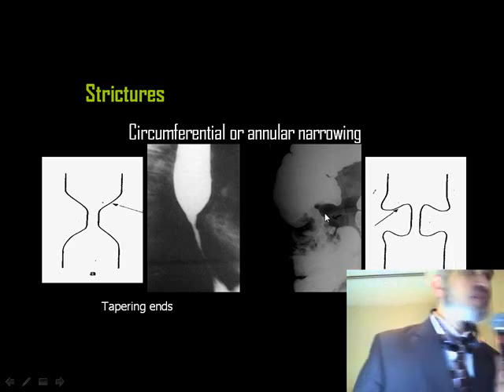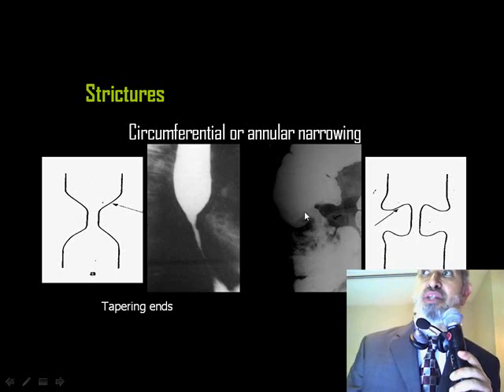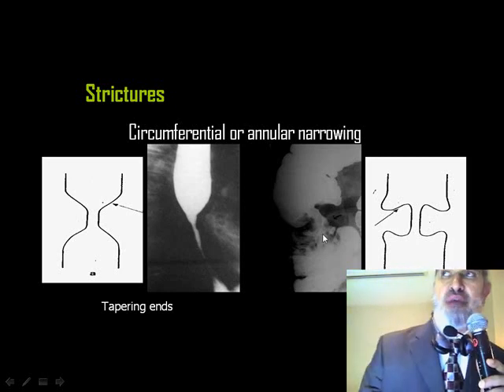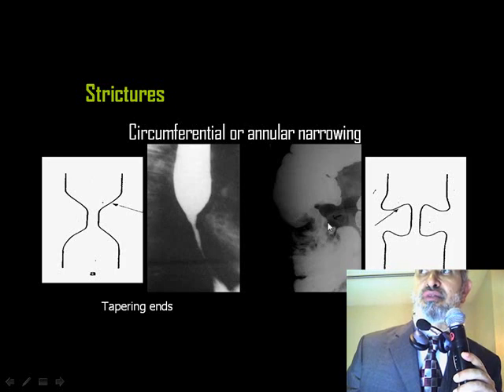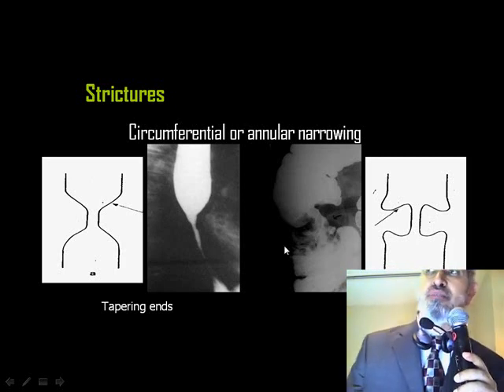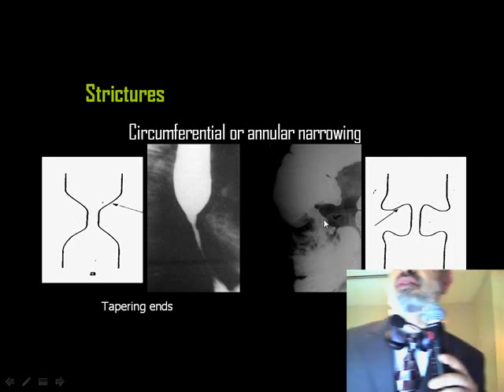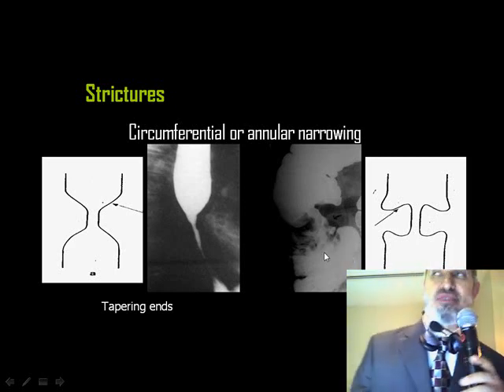It is written in the radiology books that this simulates the apple core, and you can imagine this like an apple, and someone has eaten part of it, and this means in our concepts that it should represent a malignant stricture.